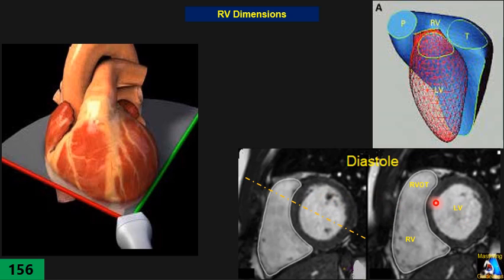This is a different MRI of the heart, short axis, PSAX on the MRI at the level of the mitral valve at the tip of the papillary muscle. We can appreciate those two regions, the RVOT region, anterior, and the inlet region of the right ventricle that is almost a rectangle, at these two different levels, especially close to the base, at this level and here.